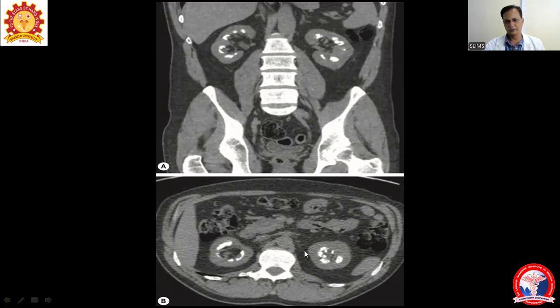Now, kidneys we are seeing. So in the last image we saw this kidney was not having calcification within the parenchyma. That was within the collection system. That was in the calyces or in the ureter we have seen. It could be in the collection system, it could be in the renal pelvis or in the bladder also. Now here, the calcification we are seeing is within the renal parenchyma, but more towards the medial region. So this is typical medullary calcinosis, what we call it.